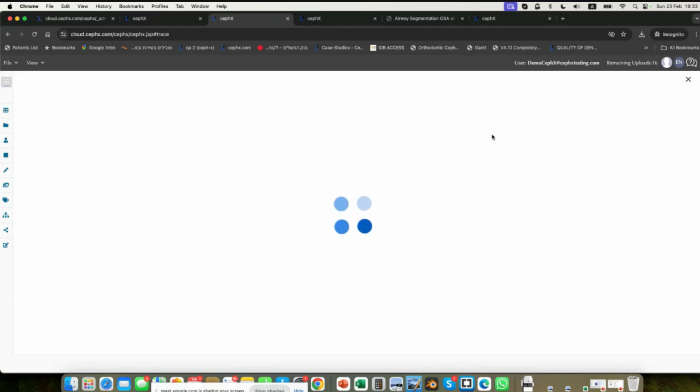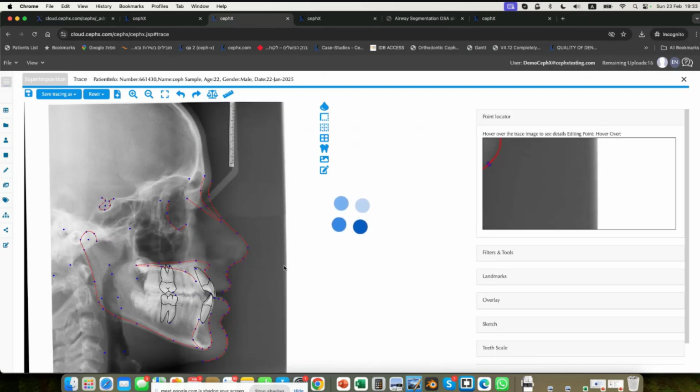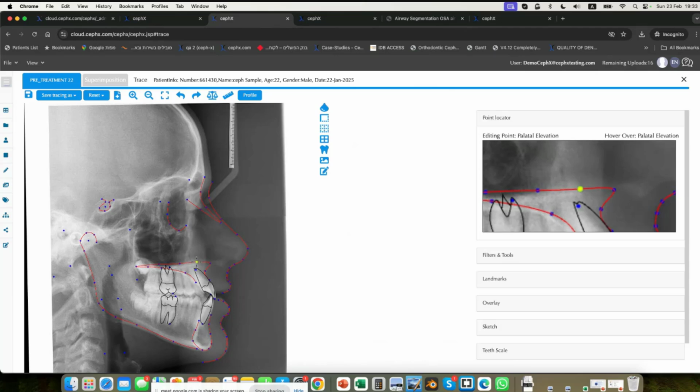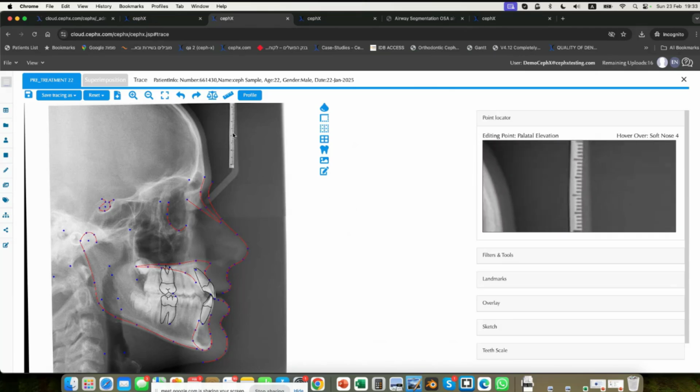Also, maybe mention the editing tools for our Ceph, Scale and Sketch. Right. So we have tools to allow you to play around with the landmarks. Again, playing around with landmarks, you just grab them, but it's pretty straightforward. Basically, when the AI recognizes that there is a scale bar, it will automatically scale the Ceph according to the bar, but that's also editable.